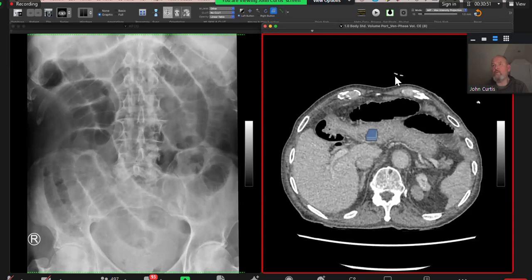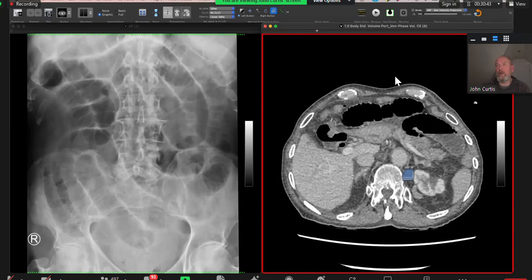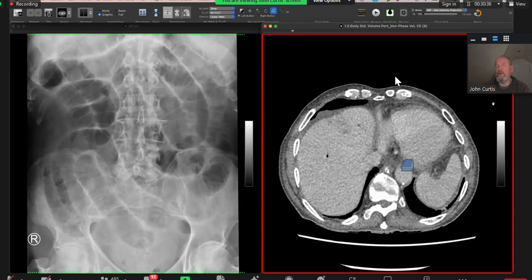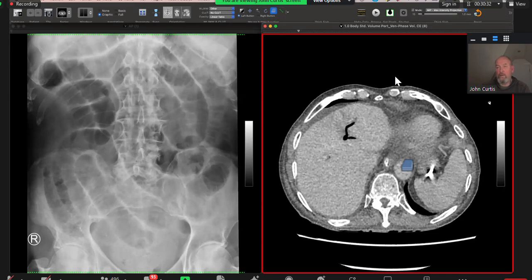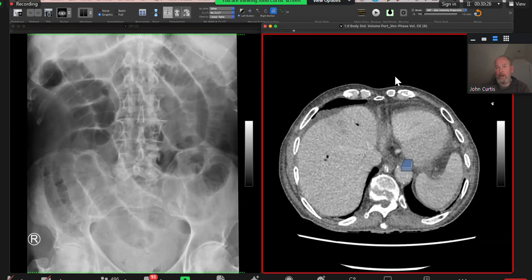Whereabouts? Where is the gas in the liver? Sorry, the images are jumping. I'll scroll for you. Thank you. So, can you see gas there? Yeah, I think that this gas is not reaching the periphery of the liver, so most probably it is due to biliary gas.